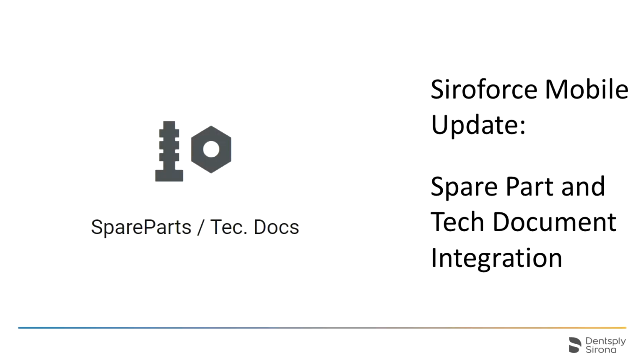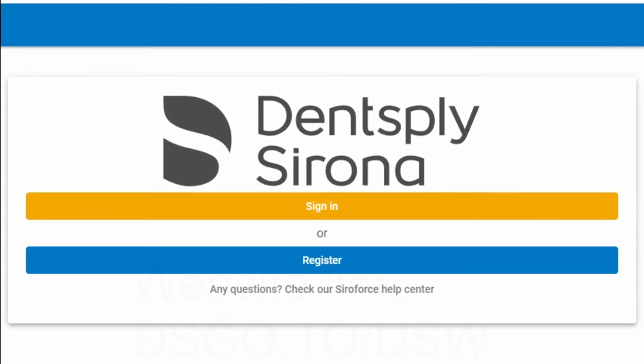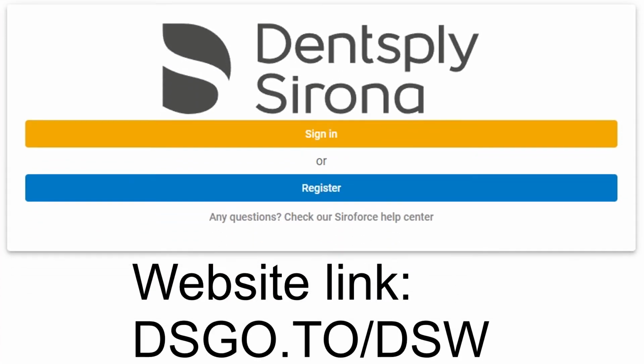In this video, we will review the spare parts application, which is now integrated into Siroforce. The Siroforce spare parts application is available on both smartphone and desktop browser. First, you will need to log into your Siroforce account to gain access.